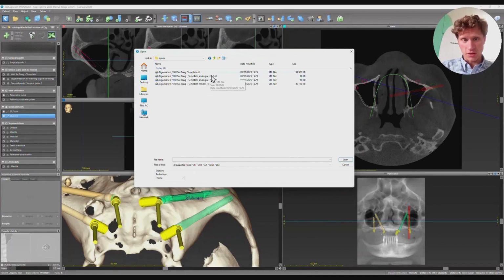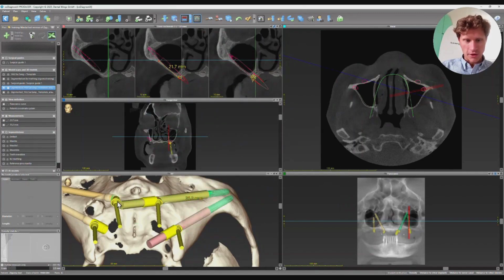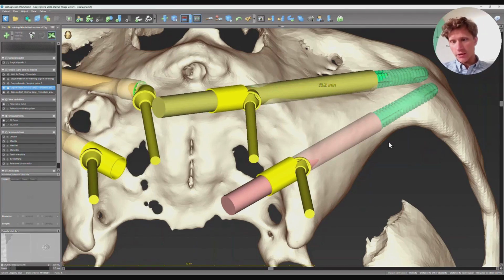You can see it here. Just select 2 of them and then click open. And now your analog is automatically here. You see that the position of them is all right. If you would like to change a little bit position of them, it's also possible.